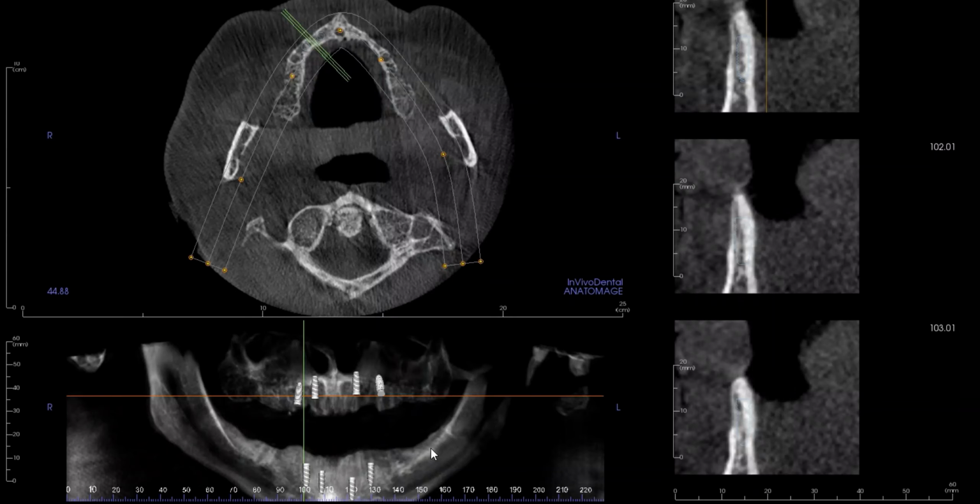So that's the tour of the mouth using the CAT scan. If I had to say, we would do upper ridge augmentation, place some mini implants so that he could have a palateless denture that is retained by the mini implants while the ridge heals. That also takes the pressure off of the ridge. The lower arch, we can place 3 millimeter wide BioHorizon implants. Because they are narrow, I would place as many as you can. I would say probably 6 to 8.